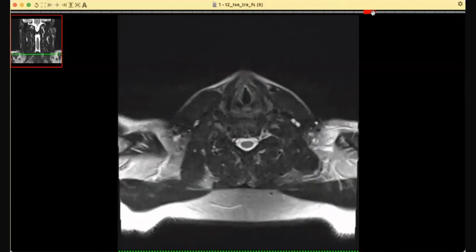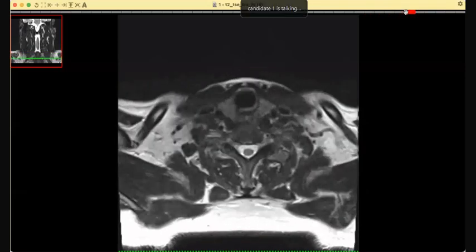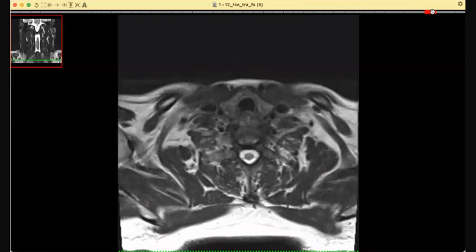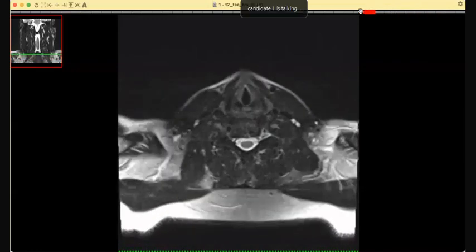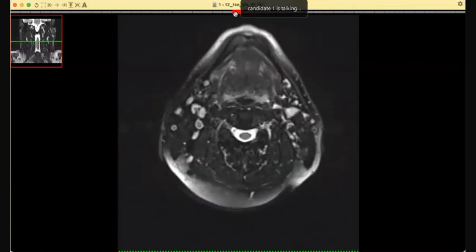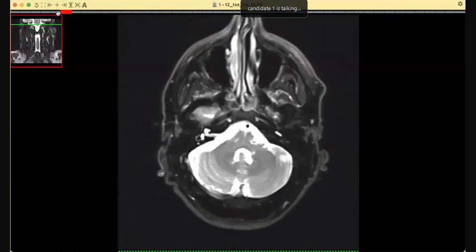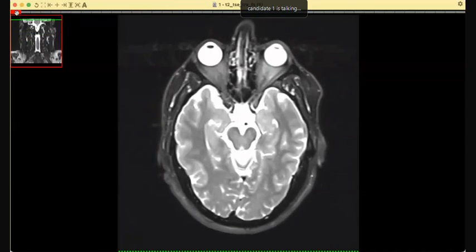Of an adult patient presenting with recurrent bilateral neck swellings, okay. So on first review, I've not spotted an immediate abnormality. So I'm just going to go through my review areas, starting with the skull base.